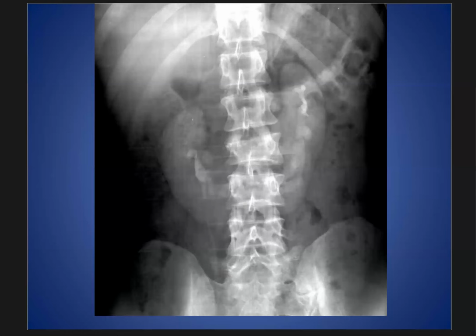Yes, there is a role of nuclear medicine in identifying the horseshoe kidney, also identifying the functioning isthmus. As we said, it is more in the lower pole in about 80%, and also identifying if there is reflux or not. Also identify the pelvic junction obstruction. As we see here, the malrotation of the calyces and some dilatation of the calyces.